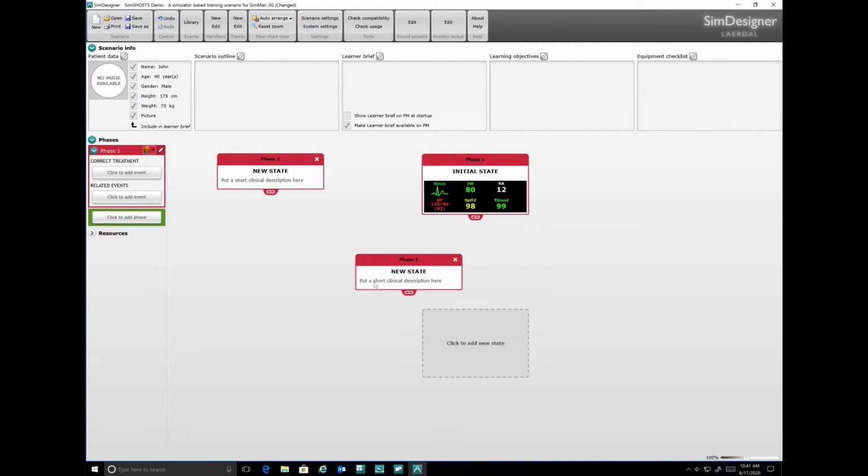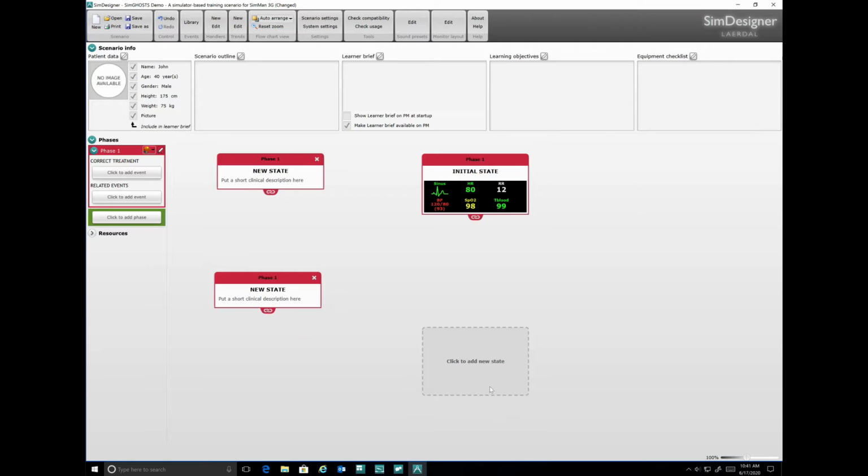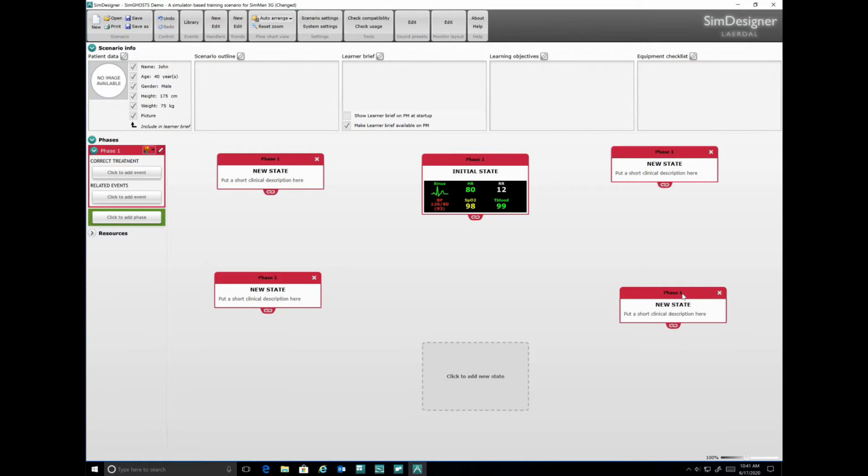This is where we create the number of states that are needed for our scenario. So if you had your states penciled out on a piece of paper, add enough states that matches your design plus 1 that we'll create as the hub.